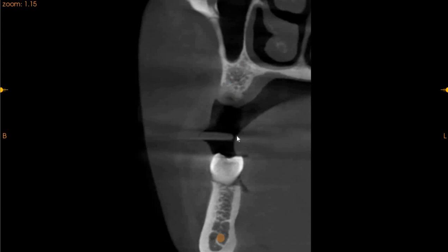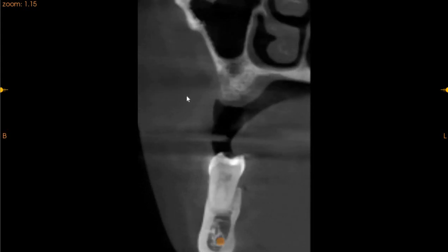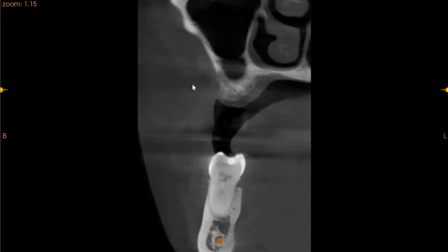If we move slightly distally towards the molar region, as you can see that the sinus comes down quite significantly, and here even though we've got very limited space because this is with a 7, it is quite mesially tilted. So a sinus lift procedure will need to be done, and 2 implants will need to be placed very close to each other. A relative measurement for you is 6 millimeters of ridge width with approximately 4 millimeters of ridge height, and an additional minimum of 5 millimeters of sinus space will need to be lifted.